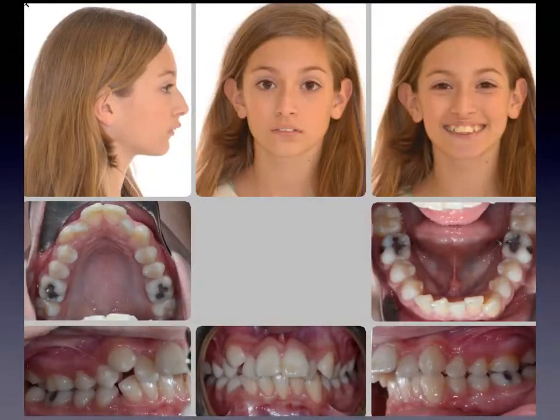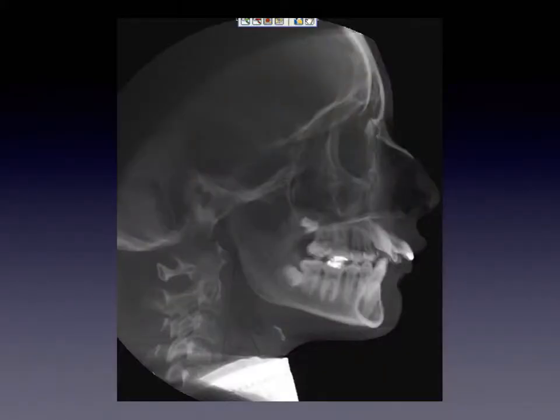This patient has a supernumerary tooth also. You can see all the crowding, the class 2 molars, and where's the lower canine? It's not there. So we look at the head film and see that the upper incisors are almost horizontal. But we can see the canine tooth in the lower symphysis area, so we can't really see much more than it's there. We can't see what the problem is.